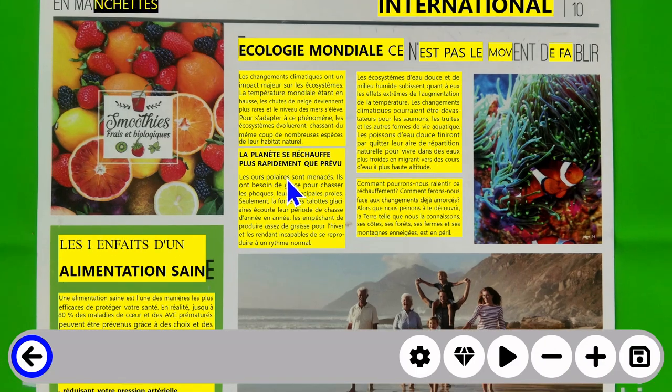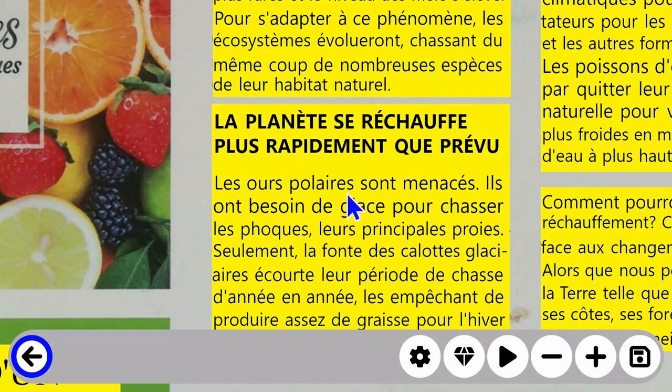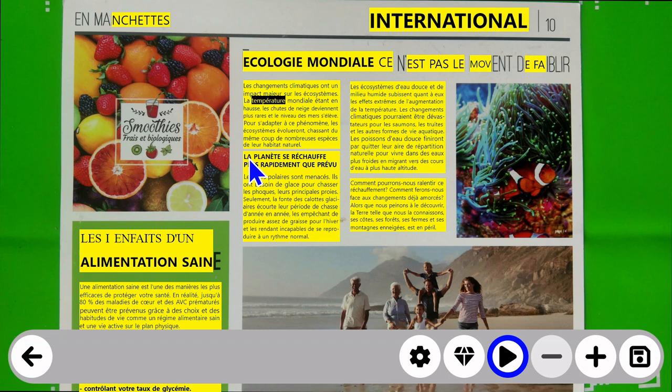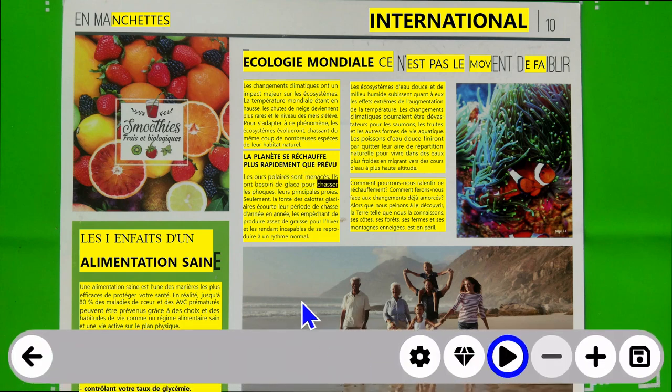So we've gone ahead and recognized all of that French text on the page there. And I'm going to have it start reading just so you can see what happens here. Again, I will cover this in more detail in another video, but I want to show it here very quickly. We can hold for about 1 second on La Planète. Notice my toolbar disappeared at the bottom. There was a tab left behind. That's a setting that I've turned on so that my toolbar will go out of the way when I'm using Prodigi to perform reading for me.